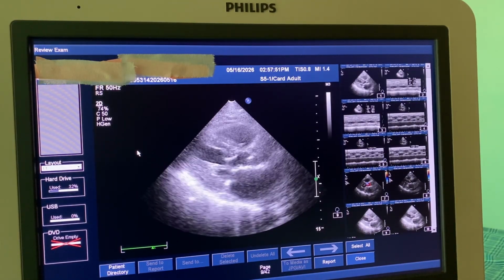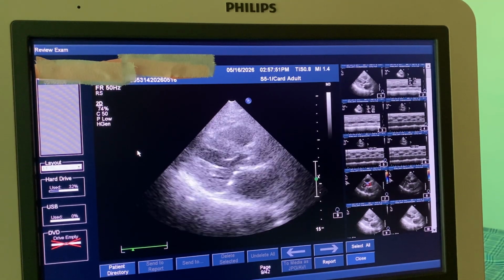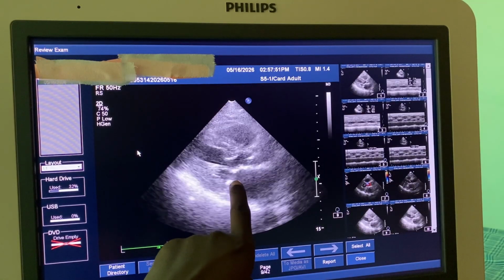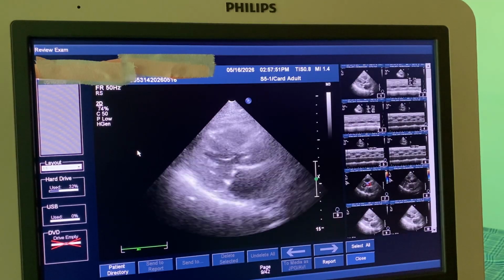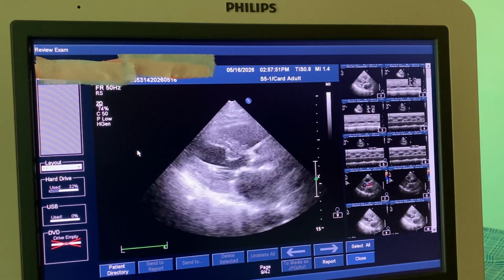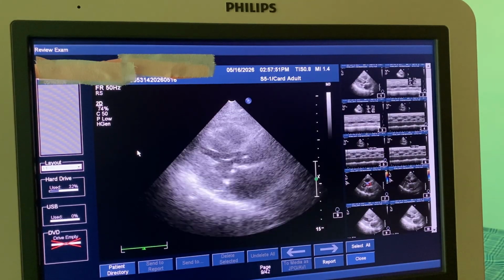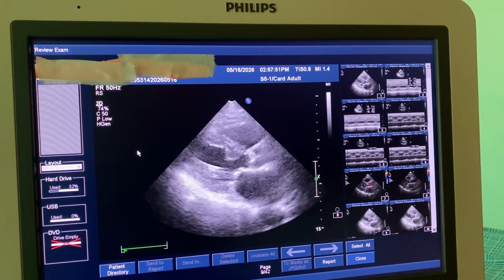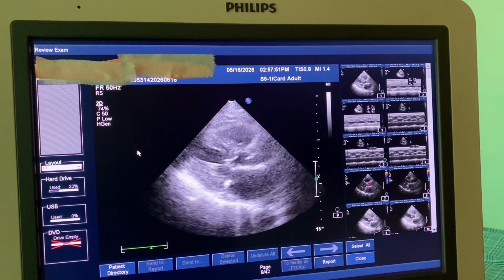The left atrium is slightly dilated. It's slightly dilated, and there are chances it is because of diastolic dysfunction. But this one is opening. But couldn't the dilatation of the left atrium be due to the stenosis of the aortic valve? Okay, how? Since we are having left ventricular hypertrophy, maybe it can't give room for dilatation, so there is that backflow pressure. We are having regurgitation at the LV.